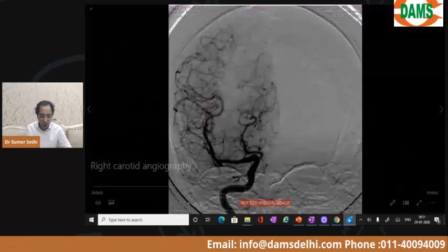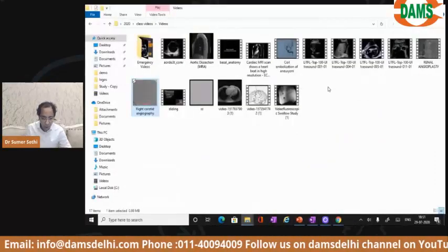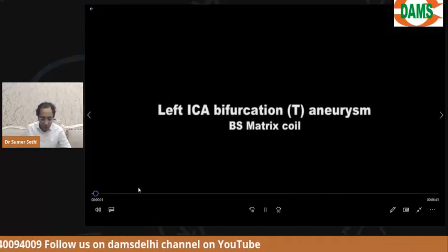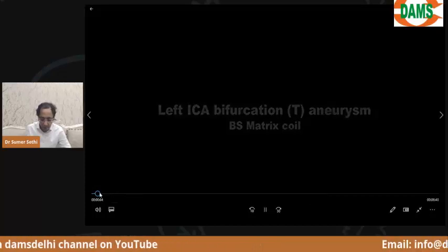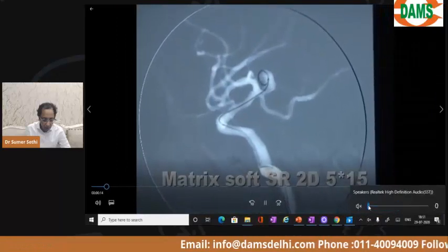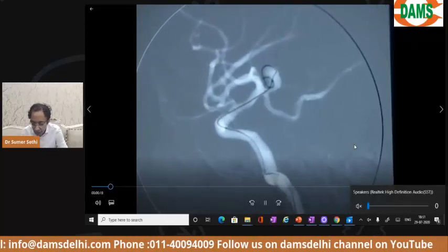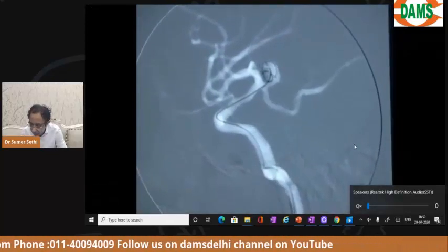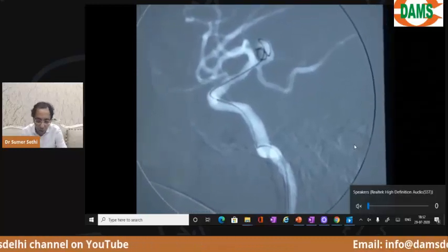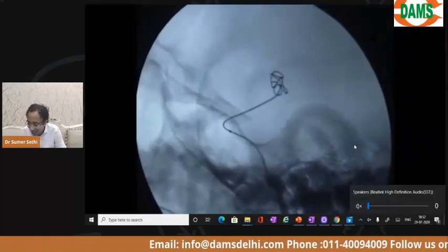Okay, now anybody wants to go to the topmost level of understanding, I'll just show you बेटा, है ना? I just want you to see a picture with me. Okay, are you able to see this? So now what is happening here is, in this DSA, okay, but that video question also is given in your DQB. ये जो video में दिखा रहा हूँ, they're given in your DQB in the video-based questions. Don't worry. Okay, now please see, beta.